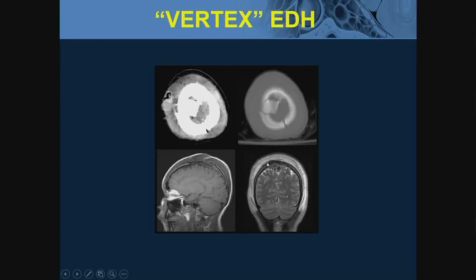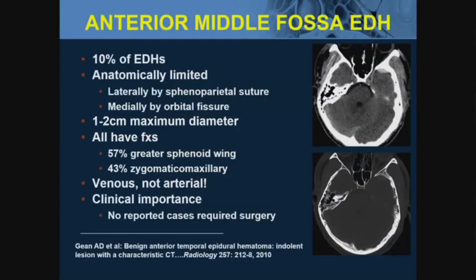So when that fracture crosses over the top of the head and engages the superior sagittal sinus, beware. It's always a good idea. You can't go wrong getting a CTA/CTV. And I always say, order a CTA. Don't order a CTV. If you order a CTV, the tech may miss the bolus. If you order a CTA, you always get the V part for free, and there's not going to be a problem with that. So CTA is our friend.